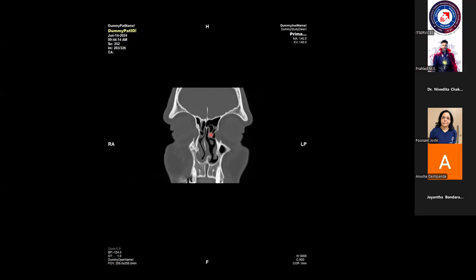So when will you say the pterygopalatine fossa is involved? Just when it involves the part posterior to the greater and lesser palatine foramen, or above that? No, if the greater and lesser palatine foramen are effaced, and the pterygopalatine fossa, that's what I'm saying. If the pterygopalatine fossa is asymmetrically widened on one side, then that is an indication of involvement on CT scan. If only the greater palatine nerves are effaced, the tumor is directly over there, and it is enlarged, then I'll just call it that the greater or lesser palatine canals, or the foramina, are effaced and it's not extending up to the pterygopalatine fossa.